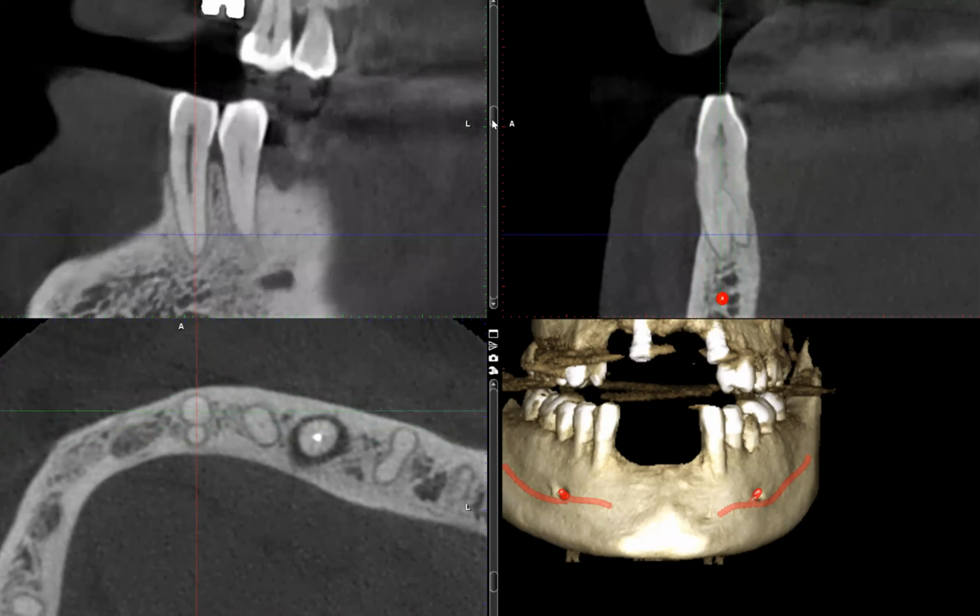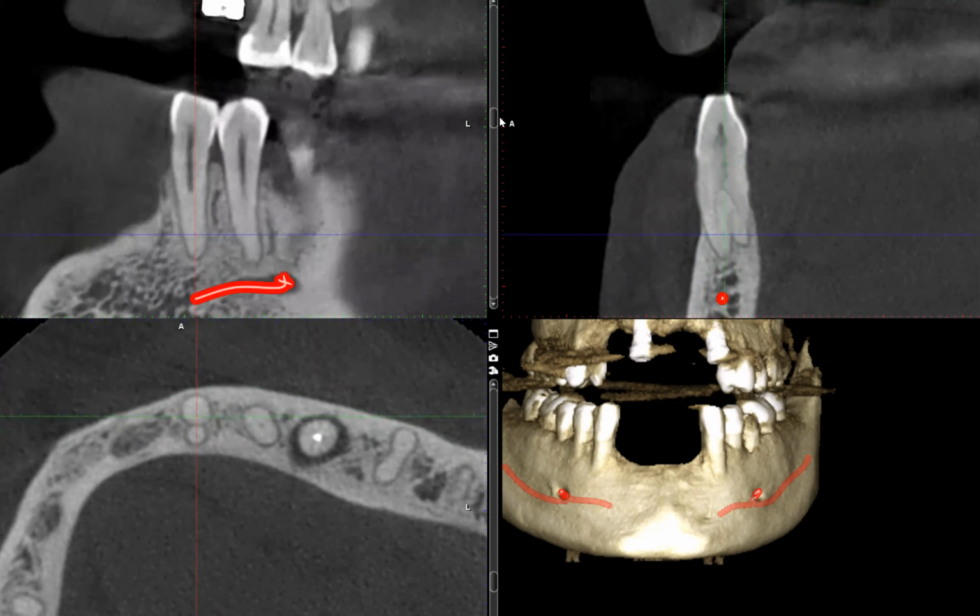So I don't have a periapical radiograph, but what typically happens with a case like this is where you can see the pulpal space very well up until the bifurcation, and from that point, it's very difficult to trace the remainder of the canal just because they are divided not only into two, but now they're much smaller in size. So if you see that on a periapical radiograph where you suddenly seem to lose the pulpal space, then that's a very good clue that it may be bifurcating at that location.